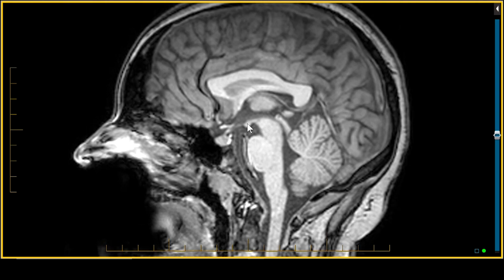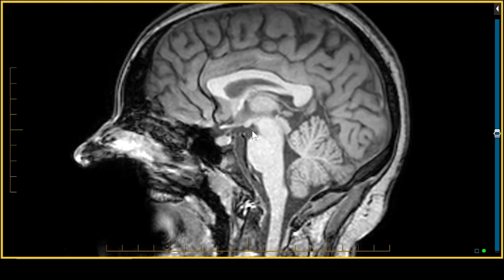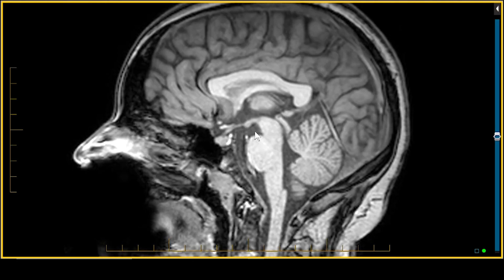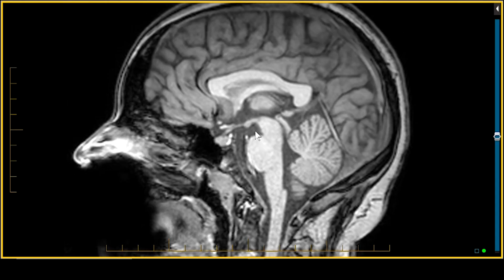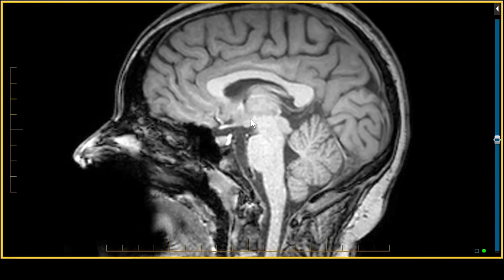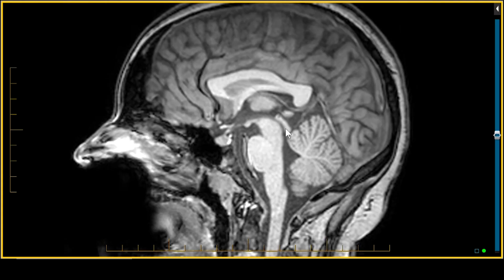Anteriorly, we've got the mammillary body, the interpeduncular cistern, through which the third nerve will be seen exiting on higher resolution imaging, and we'll show it to you separately in the cranial nerve section. If you look very carefully, you can see a little white structure ascending from the region of the mammillary body, and this is known as the mammillothalamic tract. That concludes a brief discussion of the brain stem, including a little bit of the ventricular anatomy. There's the third ventricle sitting immediately above it. Let's move on. Pomerantz out.